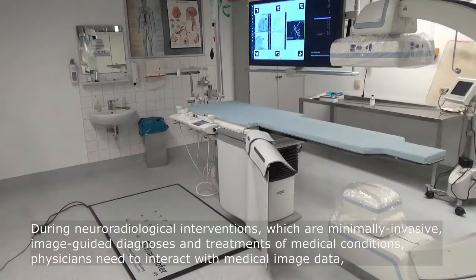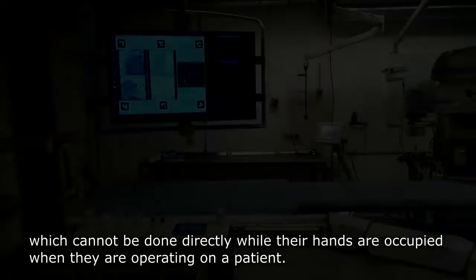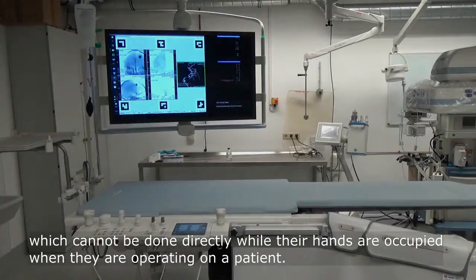Gaze-feet interaction with medical images to support radiological interventions. During neuro-radiological interventions, which are minimally invasive, image-guided diagnoses and treatments of medical conditions, physicians need to interact with medical image data, which cannot be done directly while their hands are occupied when they are operating on a patient.